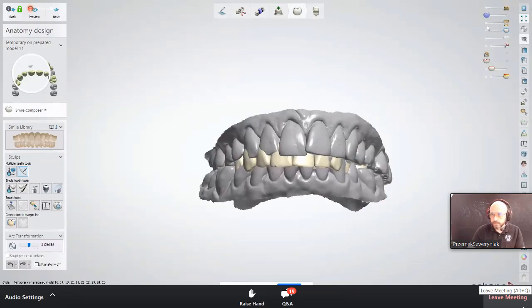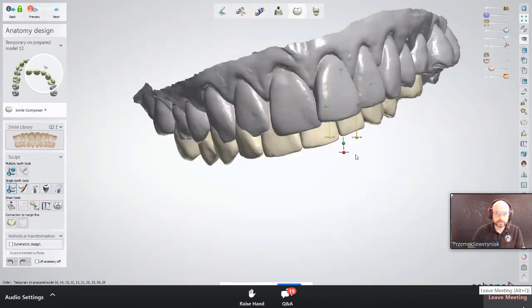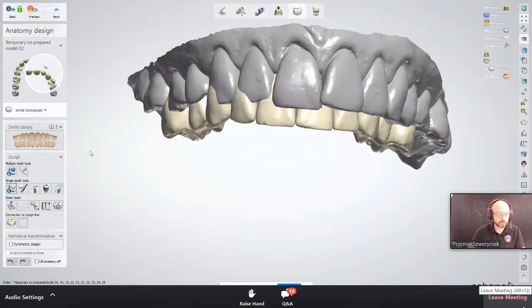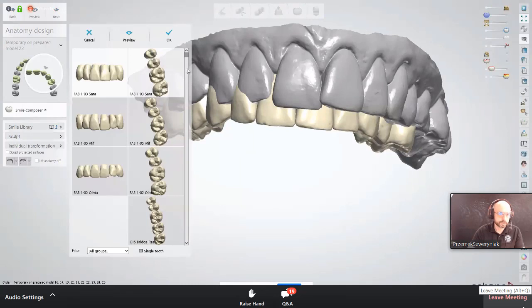So now we are in the Smile Composer, and we're going to choose the same library as I chose in the dental system. Sorry, in the Smile Design.